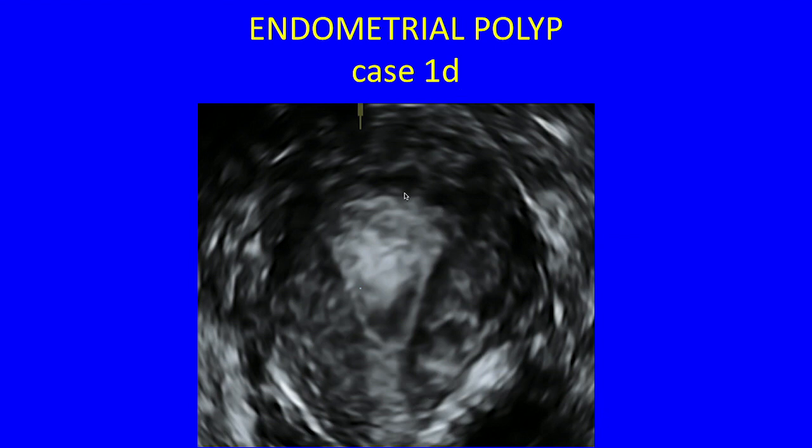This is the endometrial fundus, and there is an endometrial polyp, very bright and hyperechoic in the endometrial cavity. So again, it helped me that that area was a polyp rather than a global endometrial abnormality. When you see the endometrium's abnormal, it can be global or focal, and it helped me to work out that this was a focal abnormality.